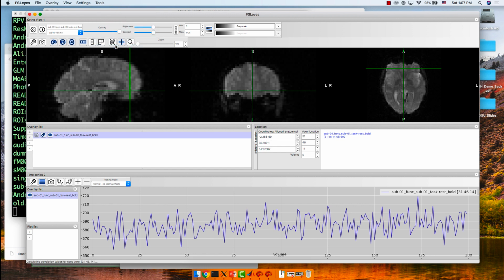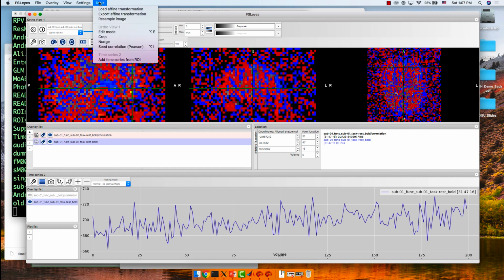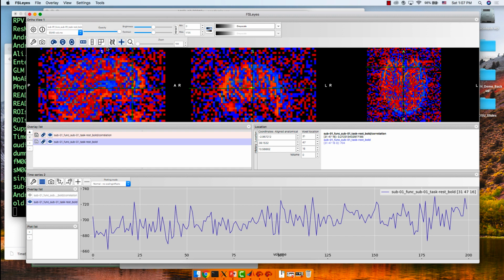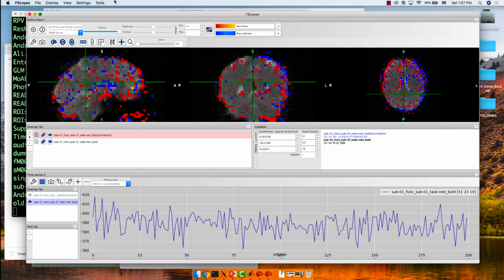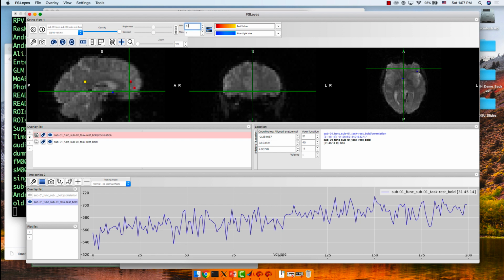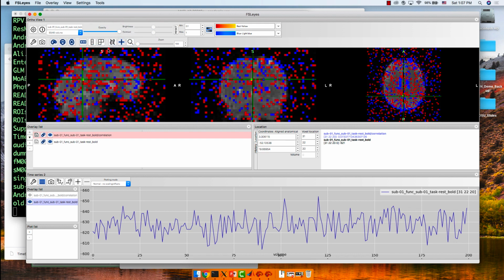All right, so I can use, this is all in FSL. If you click on Tools, Seed Correlation, this will generate... this was working better before. Find a better seed. I guess we could use that one. Still not happy with it. Sorry, let me find a good one. This isn't really working how I had it last night. I'm not going to worry too much about this, honestly.